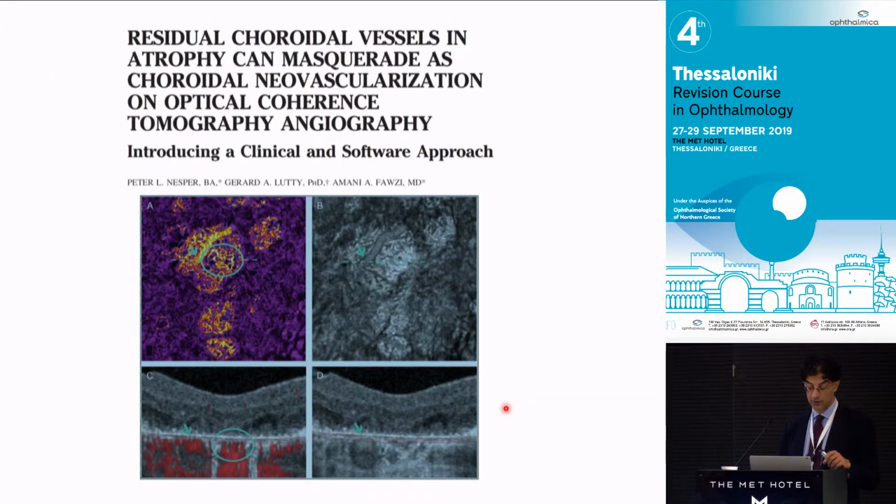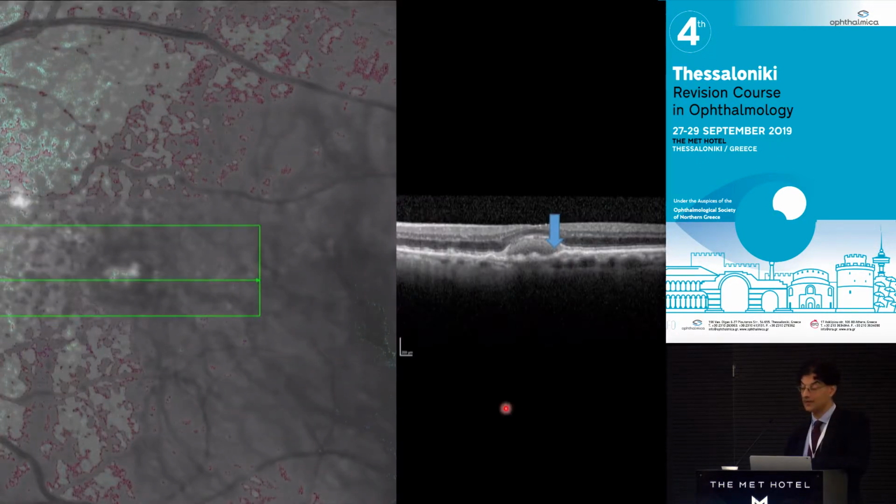Differential diagnosis. So I'm going to save this one more for the angio-OCT course. Vitelliform lesions, again, you don't want to be injecting these. So these are above the native RPE, smooth domed, even hyperreflective material. They do not just occur in Best disease or adult vitelliform. Many forms of AMD, especially reticular pseudodrusen and cuticular drusen, often coexist with vitelliform lesions. Not a reason to inject.